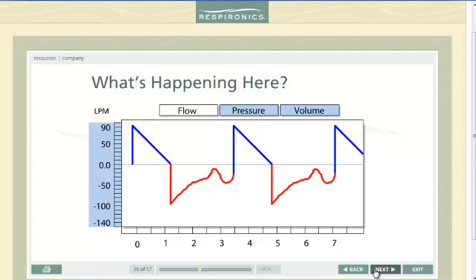breath. In flow triggering, flow is not initiated until the patient pulls through the auto-PEEP, creates a negative pressure in the lungs, and meets the flow trigger sensitivity criteria. Undetected, auto-PEEP can cause increased work of breathing for the patient. In the graphic above, the arrows indicate a missed patient effort.